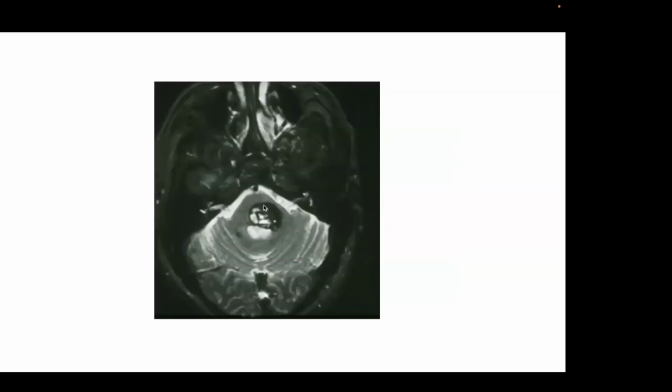Now, this is a large cavernoma, and you see the mass effect on the fourth ventricle. So again, don't get it in your mind that these lesions are small and don't displace any normal brain tissue. They can become quite large, and this appearance, these multiple areas of T2 prolongation with a low signal intensity here, completely dark rim. These are typical features with cavernomas. Don't let the mass effect lead you to a different diagnosis.